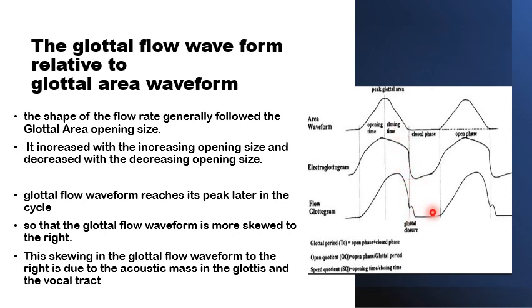during the voice production. The other thing is you would see the very gentle and slow decline of the glottal area waveform in here. In the glottal airflow, the decline in the flow at the end of the cycle is very abrupt and quick. These are the obvious differences between the glottal airflow waveform and the glottal area waveform.